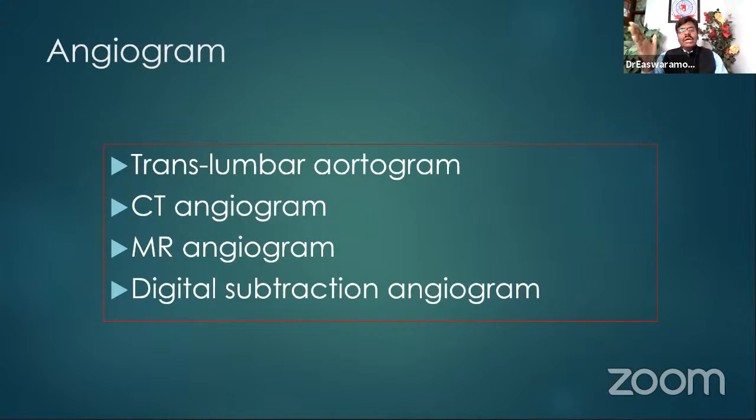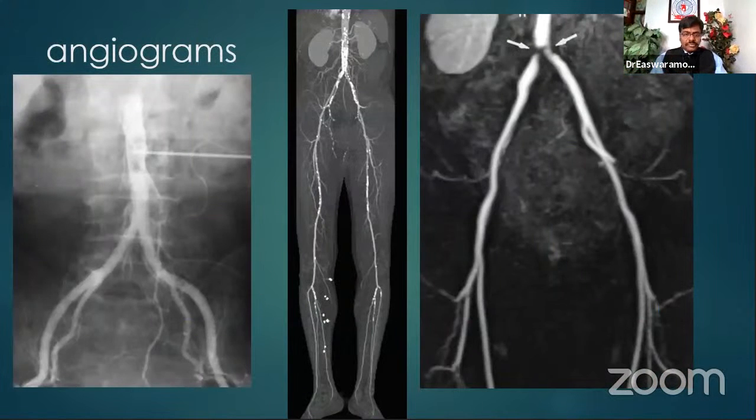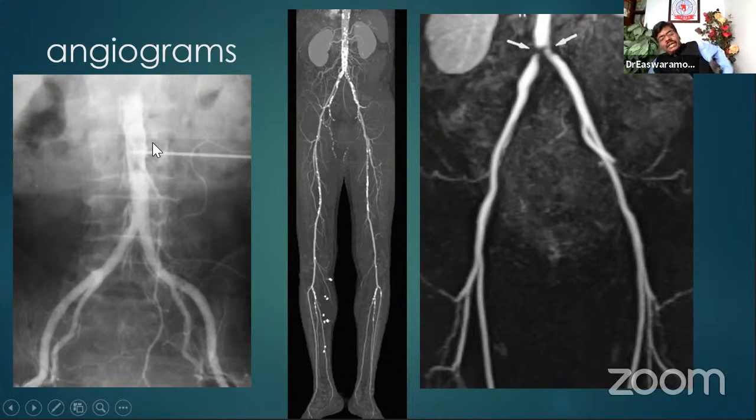Like a cardiologist, before they do an angioplasty or stent insertion, they have to get a digital subtraction angiogram. Okay, that is the first thing. Can you note the difference? Yes, sir. Here, a fine, long needle is inserted directly into the aorta through the loin here and contrast is given. Translumbar aortogram. That is only a museum X-ray. I won't say it is not. 30 years ago, we used to do aorta, common iliac artery, internal iliac, external iliac.